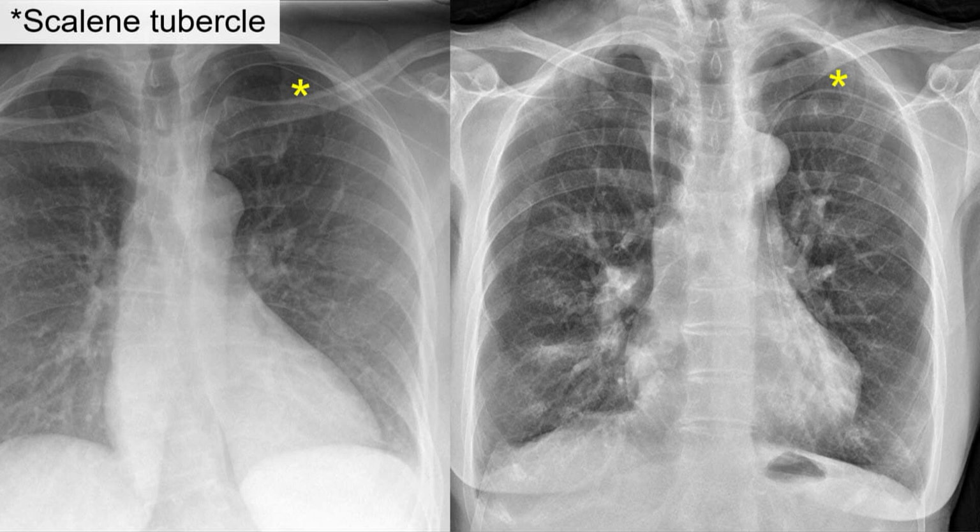Notice that this catheter arches well above the so-called scalene tubercle. It's coming down on the left, probably into the aortic arch. This one is also arching on the left and curving down along the descending thoracic aorta, but it is projecting below the scalene tubercle. The artery typically projects above, the vein typically projects below.